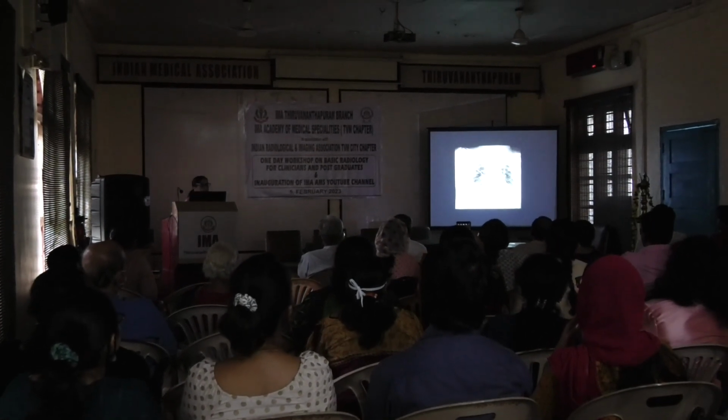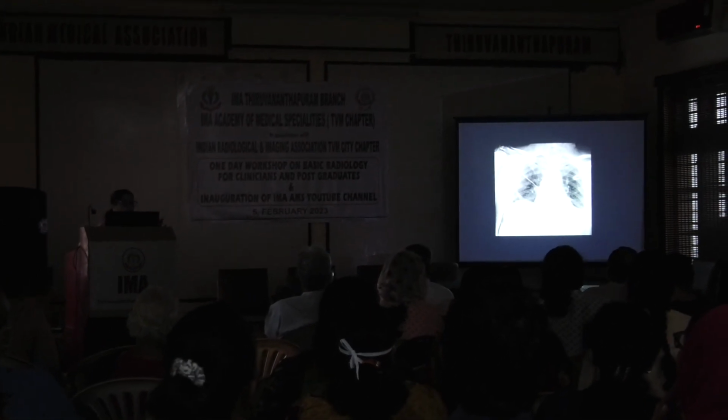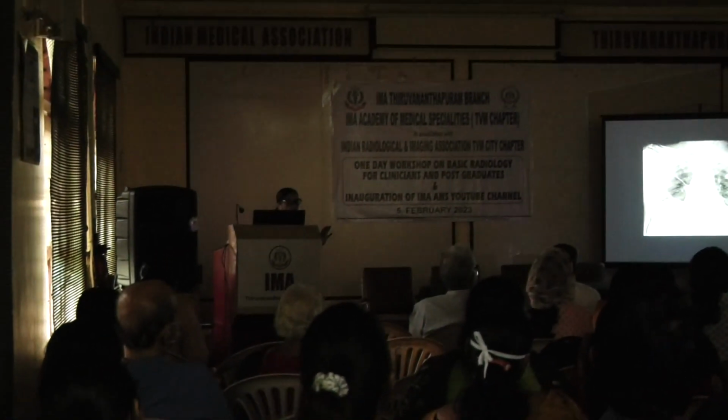Cardiac surgery done. He is in the ICU. This is an ICU radiograph which is taken. It's of course an AP image. So what is the abnormality? Will you pass it as normal or abnormal?